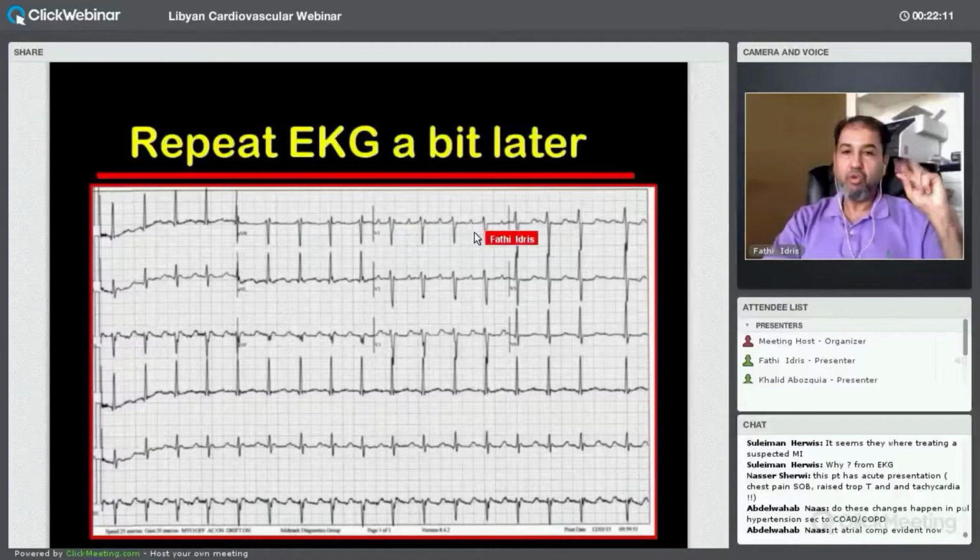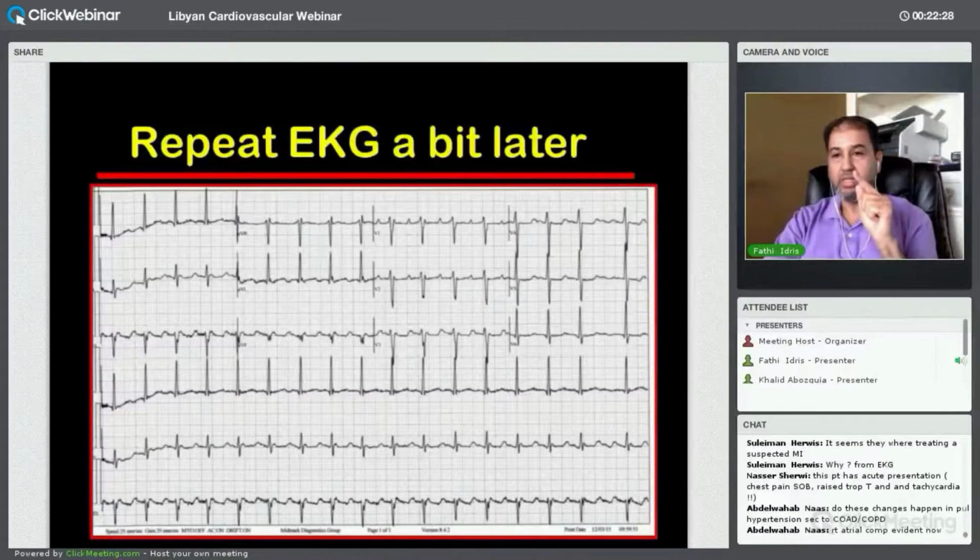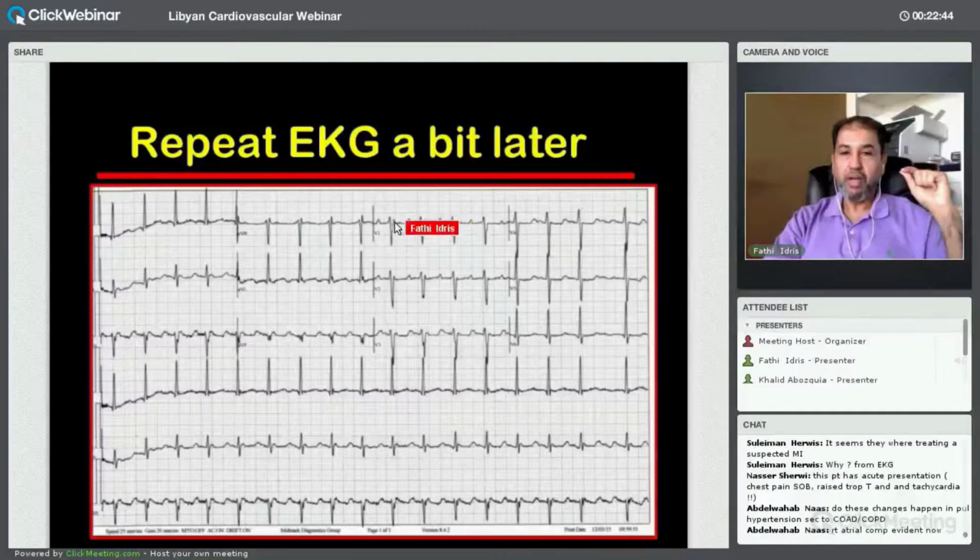So over 4 beats, you can see a change in the QRS complex, particularly the changes in the distal part of it. So that's suspicious. Bundle branch block usually doesn't go out like this, doesn't exist in one beat and disappear in the next beat. If you have bundle branch block, right or left, typically, if the rate is about the same, with no change in rates, it's uncommon for it to switch from one beat to another, although theoretically it can in very rare conditions. But if you have an R prime disappear, it makes some suspicion that this could be something else.